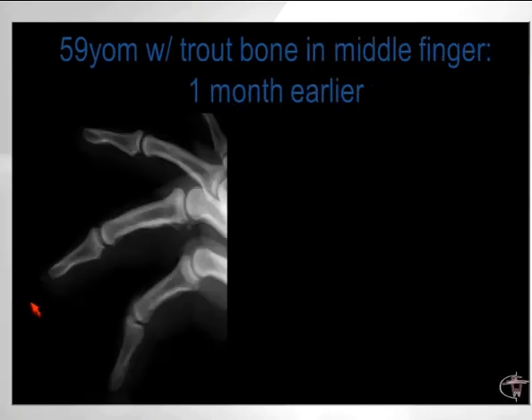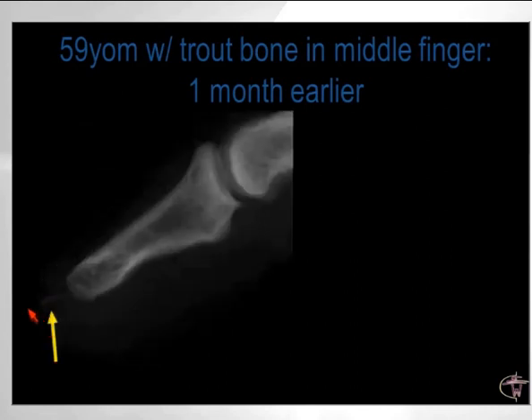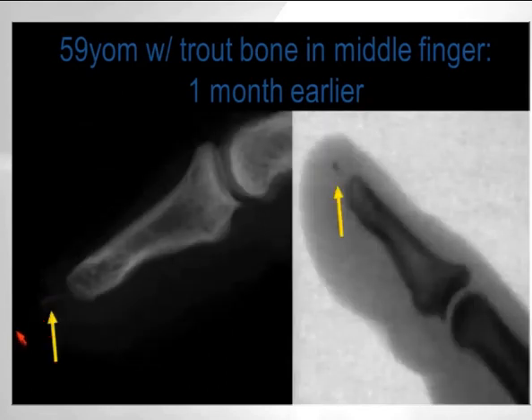This is the original image from 1 month earlier. You clearly see the bone there. This is in close-up, and here's the intraoperative picture 1 month later. Looks very similar, unfortunately missed.